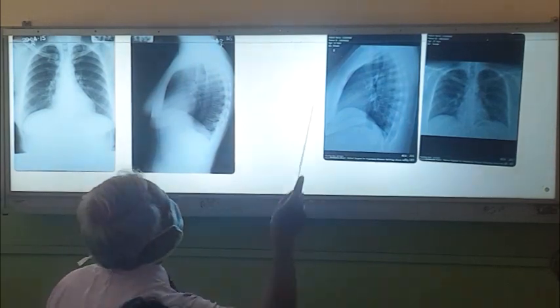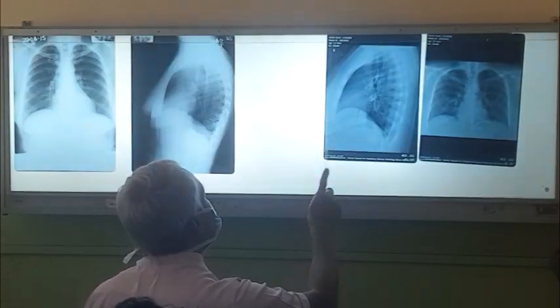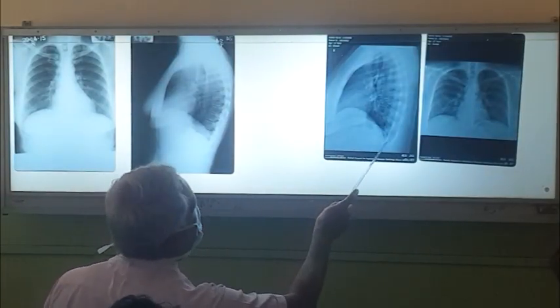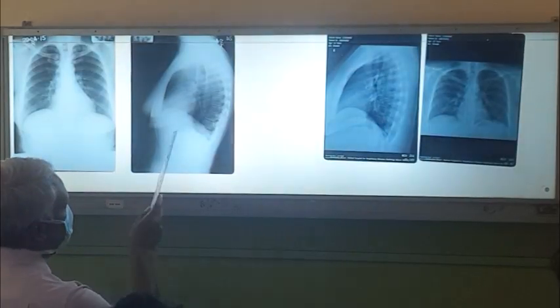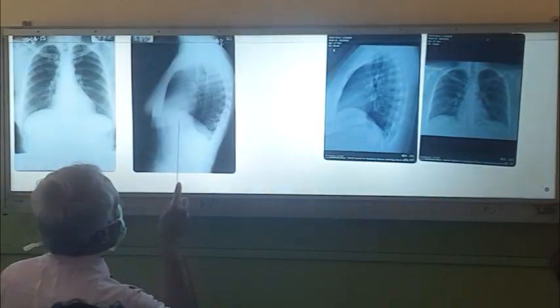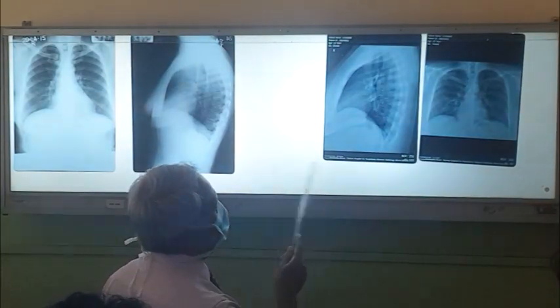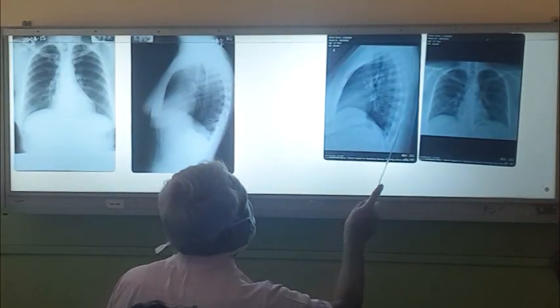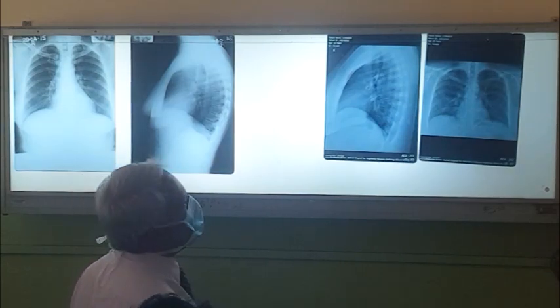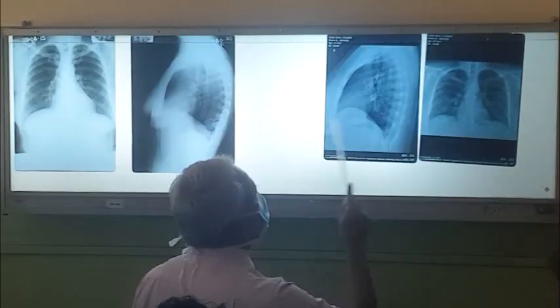Starting from the right, it is the right hemidiaphragm going up to the right side, with nothing above the hemidiaphragm. So you can trace from this end to this end. On the left side you can't, because anteriorly you have the heart, so the anterior one third you may not be able to see in a lot of X-rays, right? So this is the left, starting from here is the left hemidiaphragm. If there is a pleural effusion on the left side, you will see something like this. On the right side it is shown like this, right?